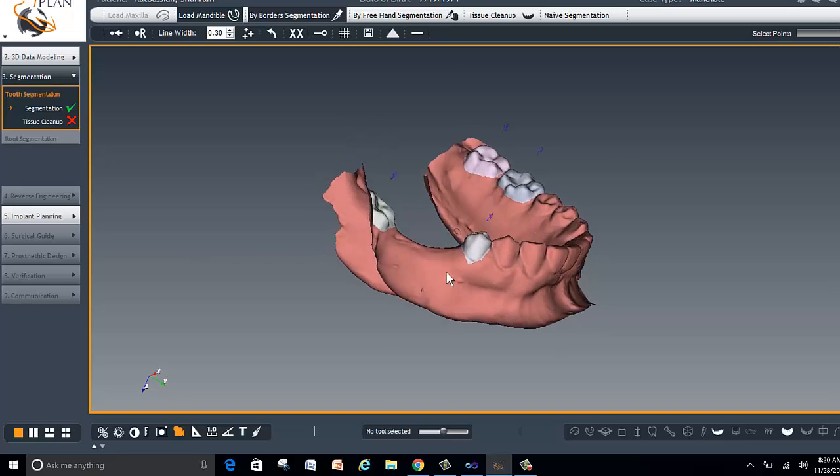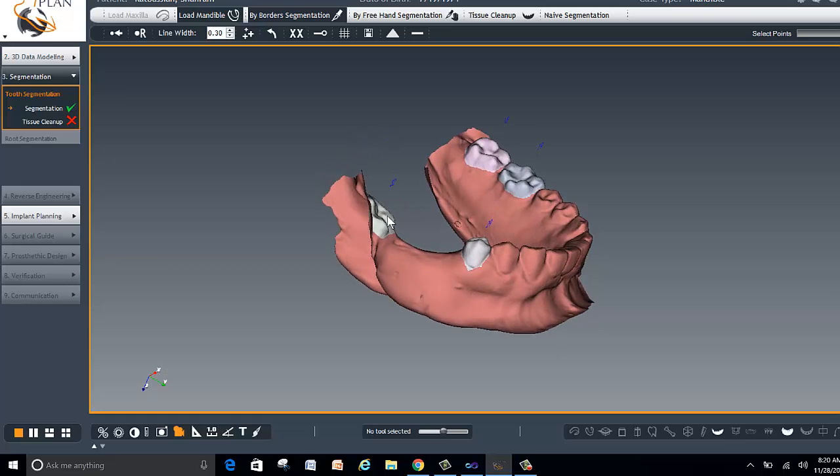But notice that tooth number 32 had drifted a little bit more mesial, so it's going to be a bit of a challenge to fit both molars here the way the sizes are. But we should be able to put 2 molars, but maybe we will reduce the volume of the teeth mesial distally by about 20%.